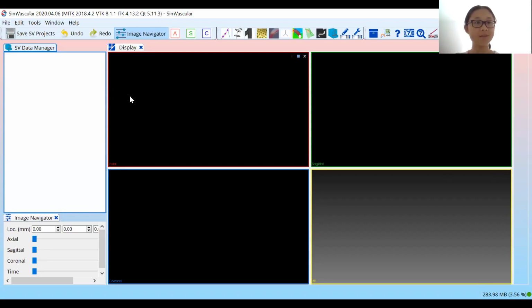All right, so hopefully everyone has opened up SimVascular now. Once we open up the program, our screens might look something like this. At this moment, everything is pretty much empty.